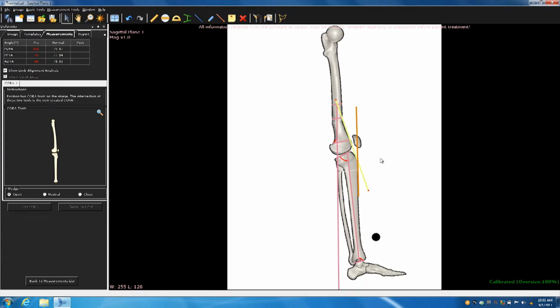So this is where the sagittal plane starts getting a little confusing. So you just keep this in mind. What you can do is say, okay, let's measure. You can come up to the angle tool. And these are things that you're doing on your own that TraumaCad maybe someday will tell you to do. But you can see you have an 18-degree anterior cortical line abnormality. You can then just right-click on these little lines that you've created. So remember, we have 18 degrees of flexion.